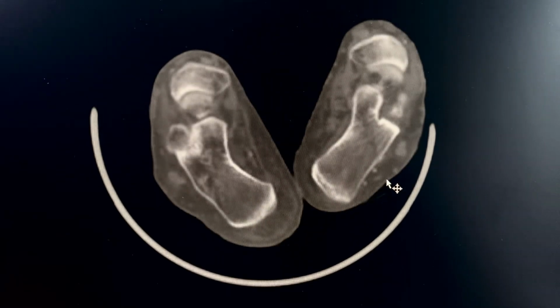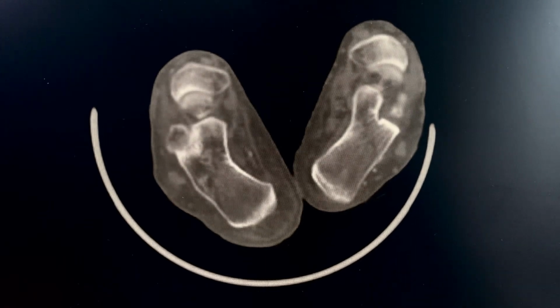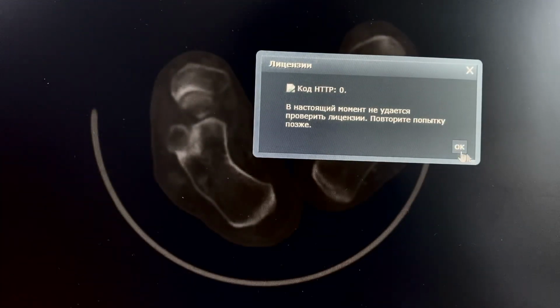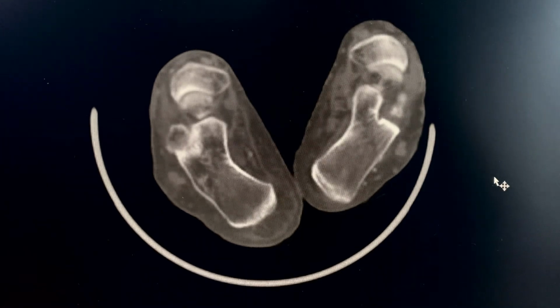So we took the patient to the OR. We did a thrombectomy. We did a hybrid operation. We did a thrombectomy of the superficial femoral artery, the popliteal artery, the posterior tibial artery, as well as the peroneal artery. We did not touch the anterior tibial artery. We revascularized just the posterior tibial artery as well as the peroneal artery. We received a very good result on control angiography.